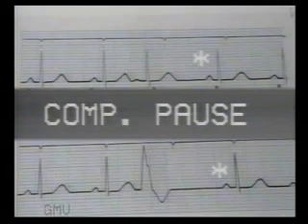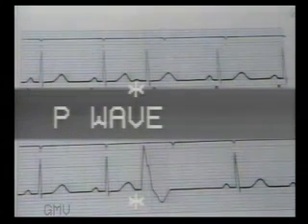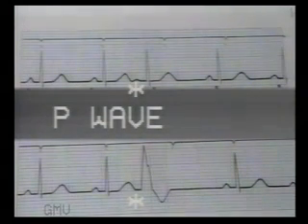The atrial premature beats have an incomplete compensatory pause, whereas ventricular premature beats have a complete compensatory pause. Number 3. Ventricular premature beats have no P wave. A preceding P wave is seen only in supraventricular premature beats, though it may not always be visible. It may be merged with the previous T wave.